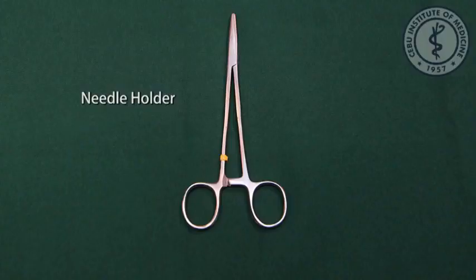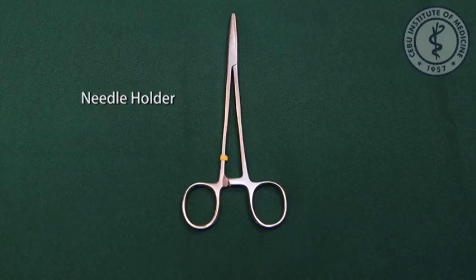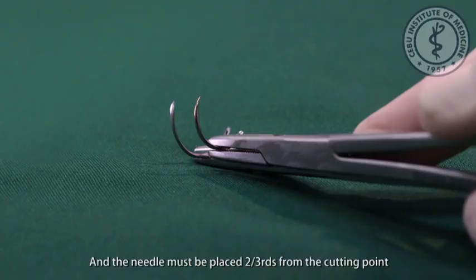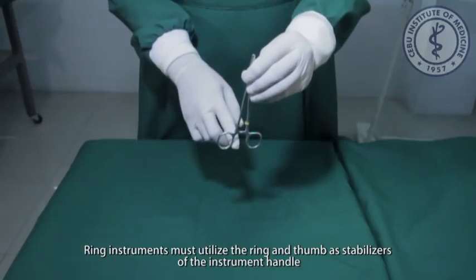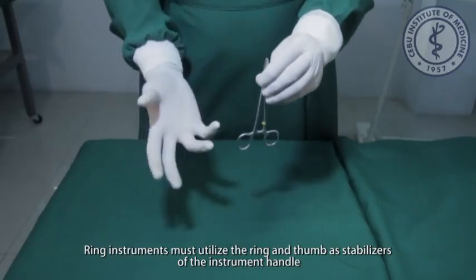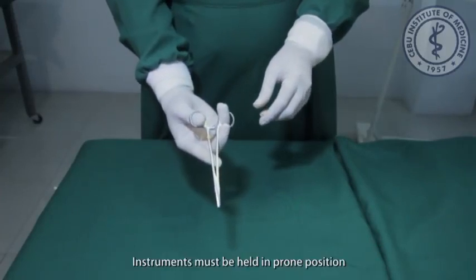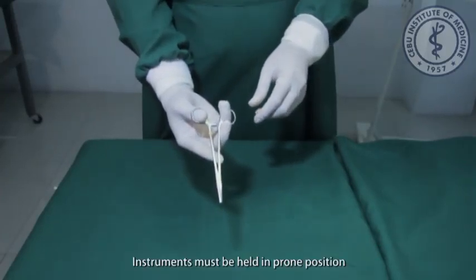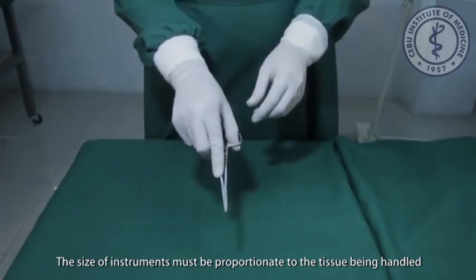Needle holder must be held in a tripod or palming technique, and the needle must be placed 2/3 from the cutting point. Handling of surgical instruments. General guidelines. Ring instruments must utilize the ring and thumb as stabilizers of the instrument handle. Instruments must be held in prone position. The size of instruments must be proportionate to the tissue being handled.